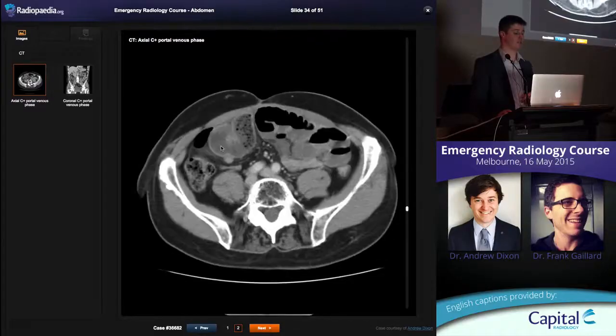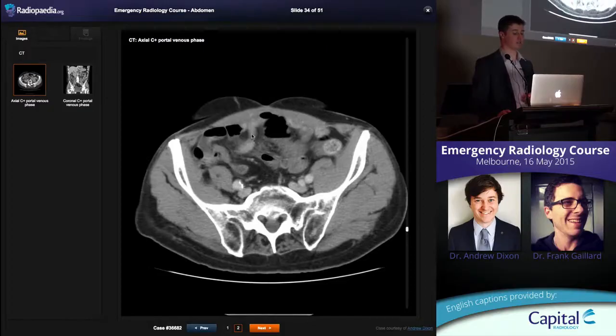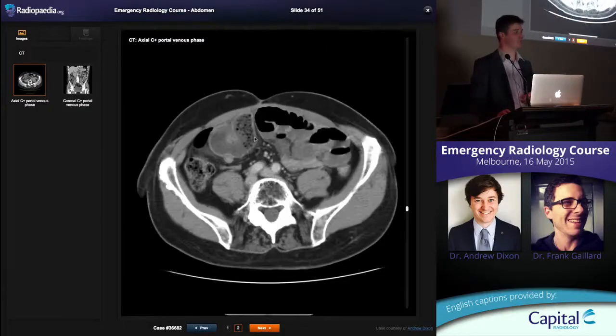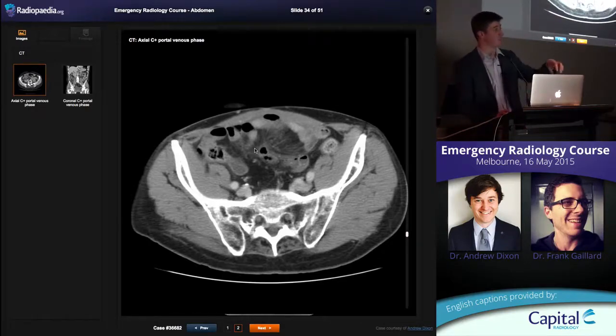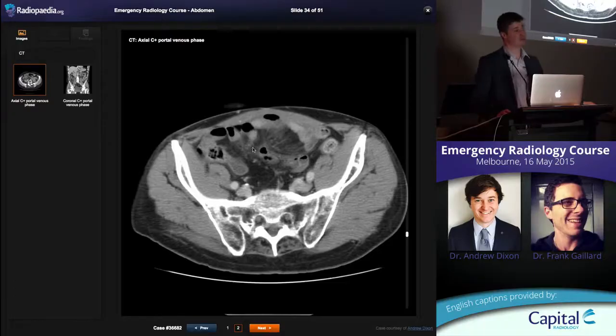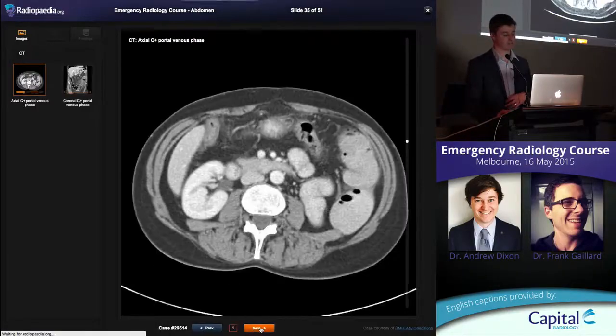If you follow that, fluid, fluid, fluid, forming feces, nice beaking here, and then collapsed loops coming away from it, okay? So that would be my tip. Confirm that you're dealing with something that's completely obstructed, distended proximal loops, completely collapsed distal bowel, and then look for fecalized small bowel. Now, it does take a little while to develop that. So if you have a very sudden onset obstruction, you're not going to push stuff along to the point where you start to get resorption of fluid and fecalization. It's usually a subacute kind of setting, but it's definitely worth looking for. You will see it in most patients.